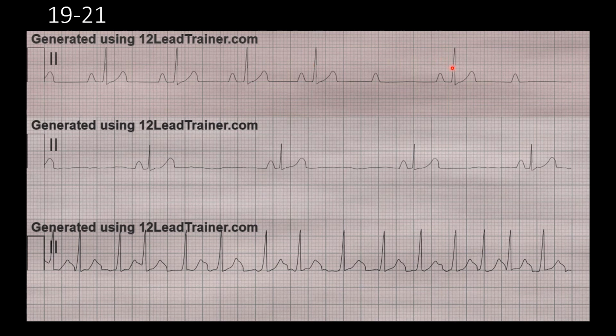So then it would be a normal sinus. So chances are this is a normal sinus rhythm. It's just the regularity and rate are affected by this non-conducting P wave. But either way, instead of naming it sinus or normal or anything like that, I would just refer to it as a sinus with second degree type 2 AV block.